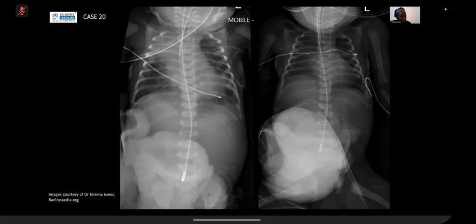And then here we've got all this abnormal opacity with some areas of lucency, as you described, which represents the extruded abdominal contents. So this is a gastroschisis or an omphalocele, but often we can't tell the difference on imaging unless we know it from the antenatal diagnosis or from when the child is born. But yeah, so this is herniated bowel contents through a defect in the abdominal wall.